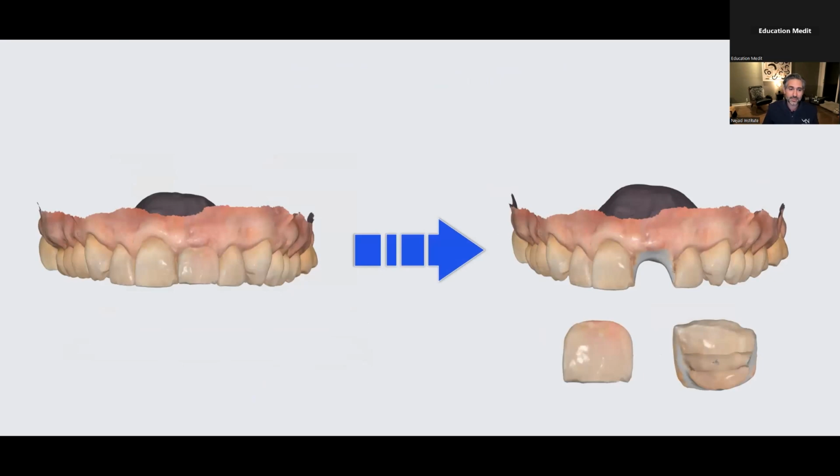So we're going to basically take our intraoral scan and we're going to create a digital extraction and a Pontic, and prepare this Pontic. I don't know if you notice here, but we're going to put a retentive groove right into the Pontic design. And we're going to prepare the Essex tray and give it to the periodontist so that it's ready for delivery on the day of extraction.